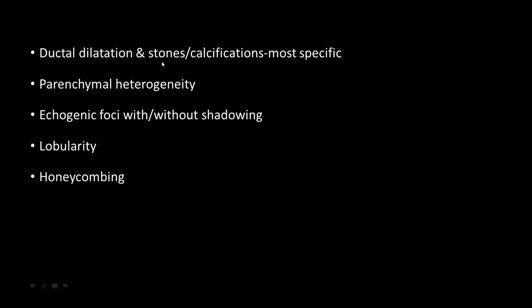Ductal dilatation and stones, as well as pancreatic parenchymal calcifications, are the most specific findings on ultrasonography. Apart from that, we can see parenchymal heterogeneity, a few echogenic foci with or without shadowing, lobularity and honeycombing. These findings are specifically seen on endoscopic ultrasound rather than transabdominal ultrasonography.